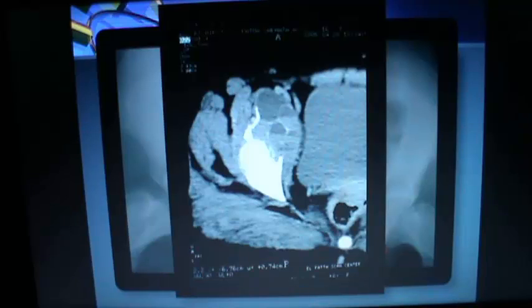This is an aneurysmal bone cyst of the superior pubic ramus and the acetabulum, pushing everything to the left, and we should consider that the lesion is well defined because the fat planes are intact, although the cortex is not followed because of the marked thinning and rarefaction.